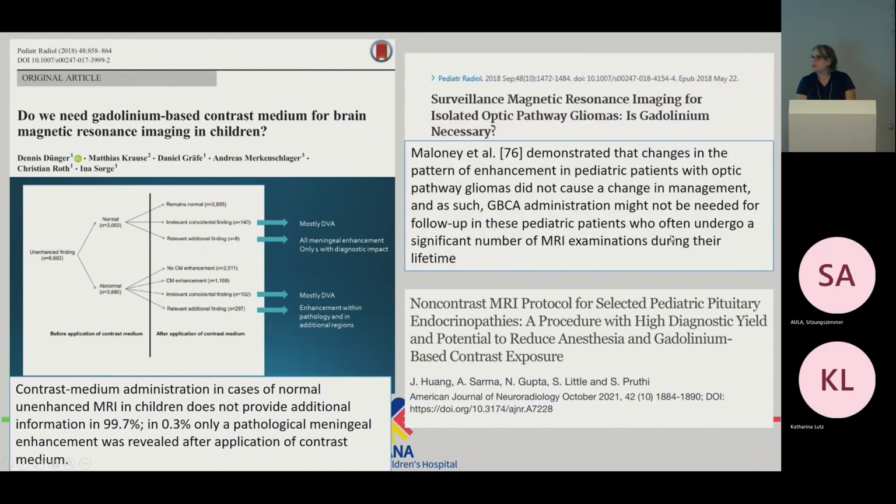And also, for tumors we always say, of course, with and without contrast, but for optic gliomas, this work raised the question: we make the diagnosis with a full study with and without contrast, but these children get a study every 3 months, 6 months, or a year, depending on the rate of growth. Do we really need to give contrast again in each follow-up study? The answer here was actually no, because they found that changes in enhancement pattern didn't really change the treatment decisions related to these children.